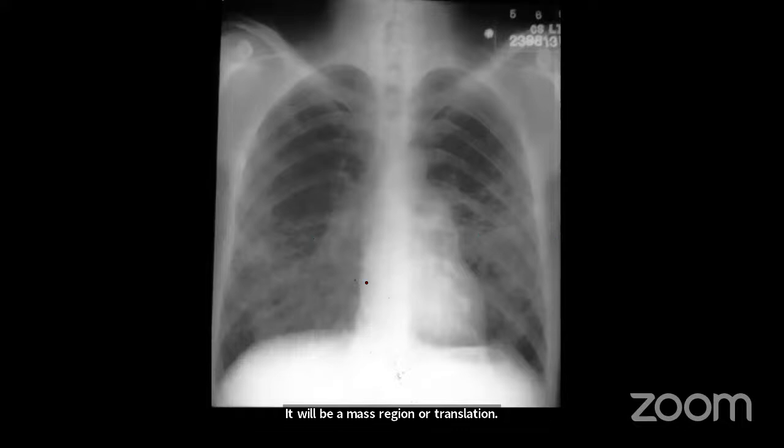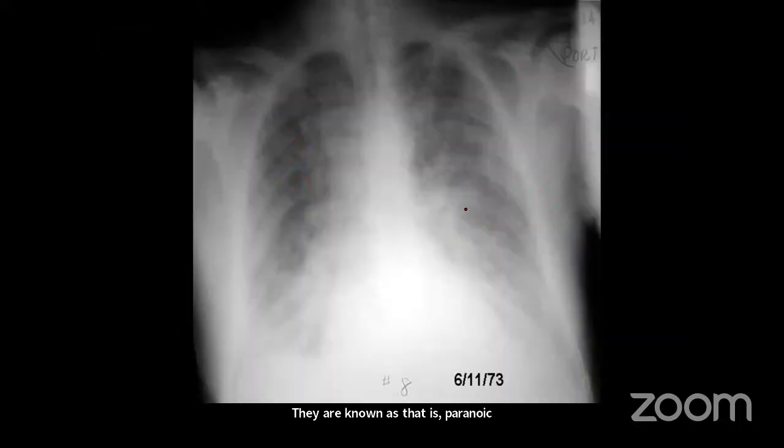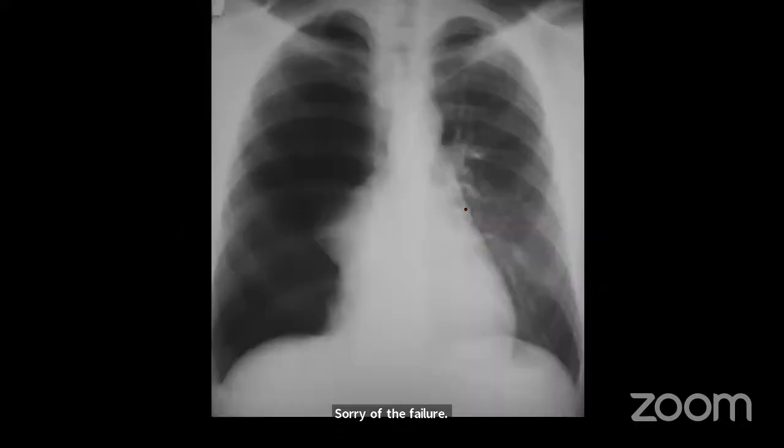Then we have lesions on the X-ray shown like reticulonodular, right? These are cases of pulmonary fibrosis. What do we see here? So here is a patient with cardiomegaly and with a pacemaker. We can see horizontal lines. These are actually Kerley B lines, which are very prominently seen in patients with cardiac failure. Although the patient may not be too symptomatic, if they say they are having breathlessness, especially at night, and if we have just an X-ray and we see these Kerley B lines, then they are pathognomonic of cardiac failure. Okay, what do you see here? Very easy.